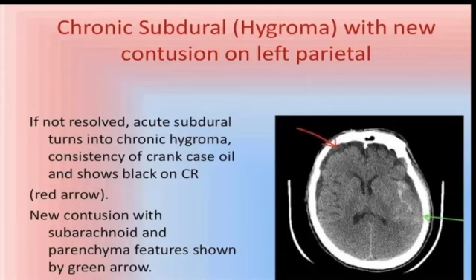Okay. Now, after you've finished looking at the periphery, please start comparing the sulci. As you're looking at the sulci, you can see here on this side the dark areas for the sulci. Now, you should look at the mirroring parts, and then you start seeing whiteness in these areas. This should make you think, okay, this patient probably has bleeding or blood in the subarachnoid space.